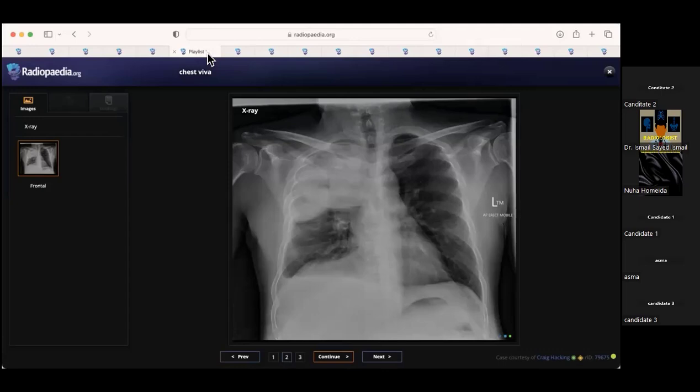So why did you say Klebsiella? Why did you pick Klebsiella? I think because it's causing complete opacification of the right upper lung lobe and maybe the middle lobe. And what else? What's the buzzword, or the thing that is specific to Klebsiella that it would cause?